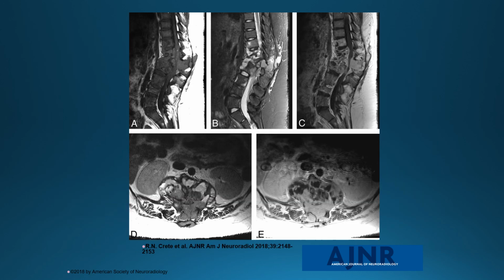One more patient with coccidioidomycosis of the spine, extensive involvement of the vertebrae, as well as the epidural space and the prevertebral soft tissues.